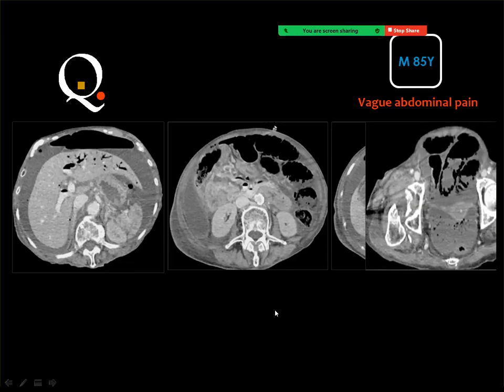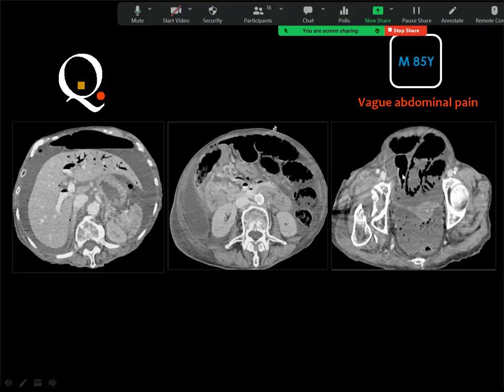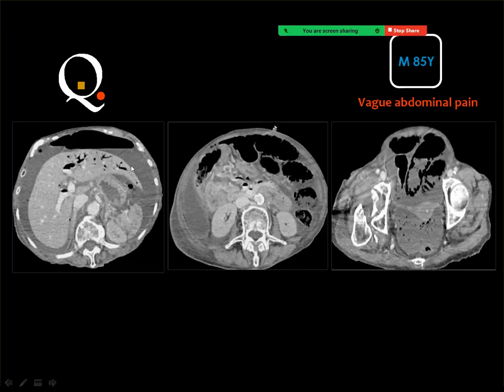And this intestinal ischemia is also diagnosed by the presence of air in the wall of the intestine, pneumatosis intestinalis, and the enhancement of the affected intestinal segment. Then this intestinal ischemia may be complicated by pneumoperitoneum associated with ascites.